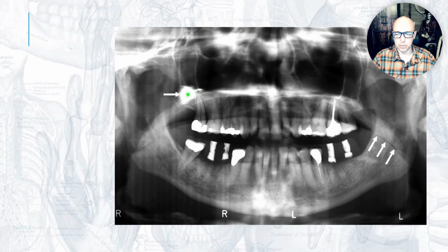And this is just a ghost image of what? We don't really see anything on the other side. In this case, it's not this big crown, but it's an earring that doesn't show up on the other side in the image because you don't see that far back on the earlobe. And so, earring ghost image, just projecting over these things. Always take off earrings, necklaces, anything metallic. Glasses, even plastic glasses like mine, should be removed. Sometimes there's metallic screws, although I will say that's not the biggest deal.